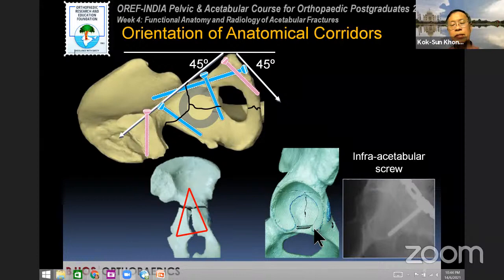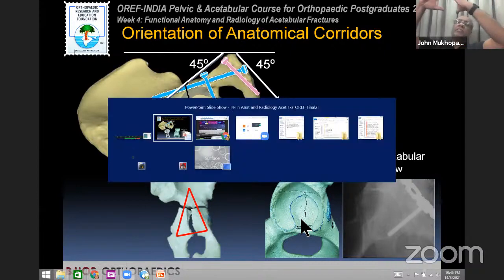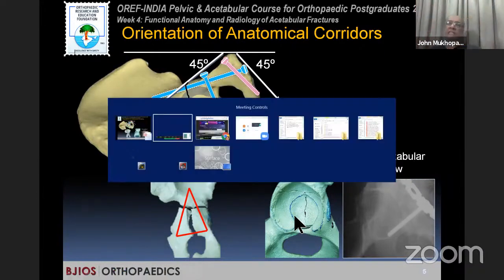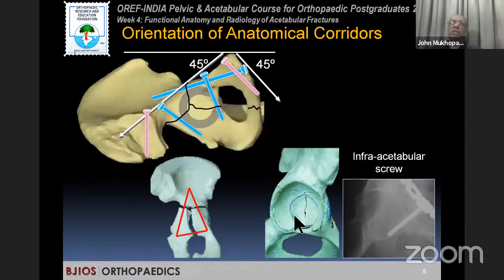A lot of people are not really sure where the teardrop is. But I believe this looks like a teardrop if you look at it from a different angle, from the anteroposterior. This is looking directly from lateral to medial. It's an overlapping shadow of that which is at the level of the medial wall of the acetabulum, which is what is seen radiologically as the teardrop. If you explain that to the examiner, he'll be satisfied. Should be.